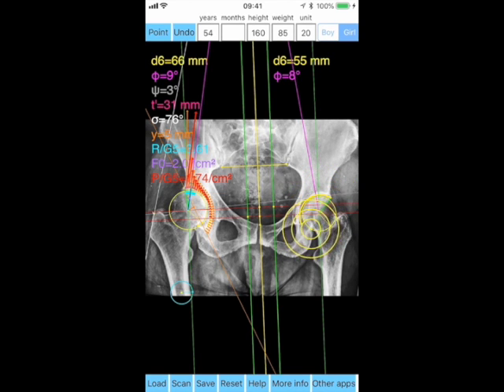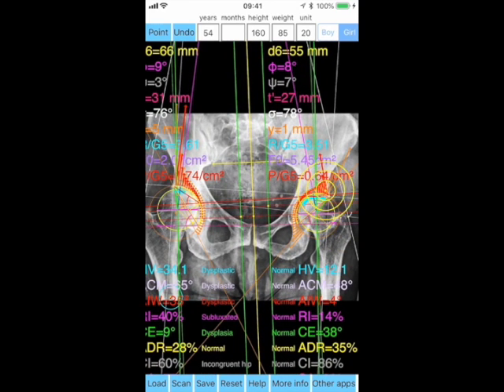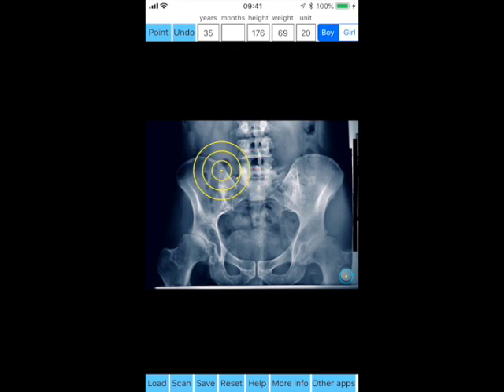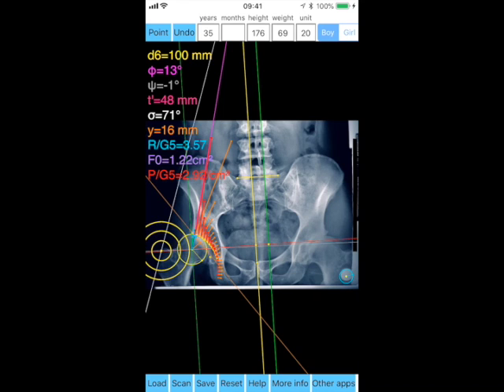C13, femoral head center; R14, dynamic circle radius of femoral head; E15, lateral acetabular margin of acetabulum; A16, deepest point of the acetabulum or the triradiate cartilage; V17, acetabular teardrop; D18, femoral head intersection at the posterior-inferior acetabular margin; T19, insertion of the hip abductors on the greater trochanter.